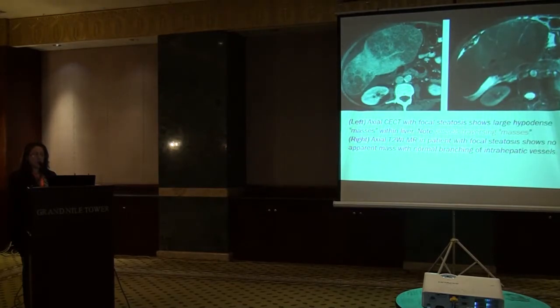This is a post-contrast enhanced CT scan showing 2 large focal lesions, but there are vessels traversing the lesion.